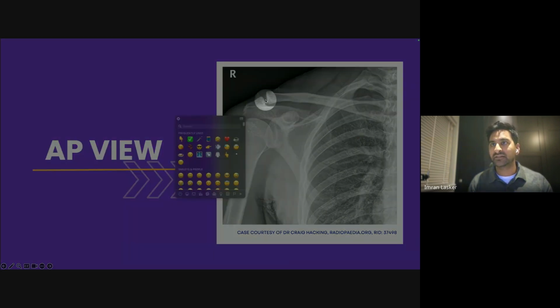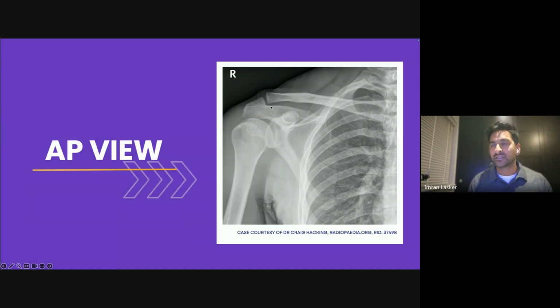Next bit to know about is the acromioclavicular joint. That's the acromioclavicular joint. Now you can imagine, maybe you've seen it, that some people have actually got a fractured clavicle. Sometimes that clavicle becomes dislodged. You get dislocation of the clavicle, and you get stages of dislocation.